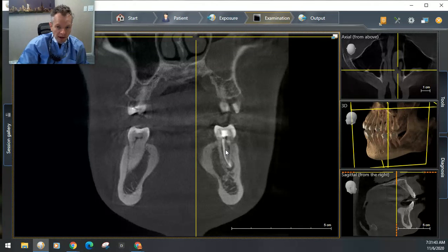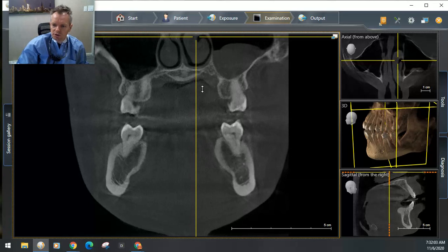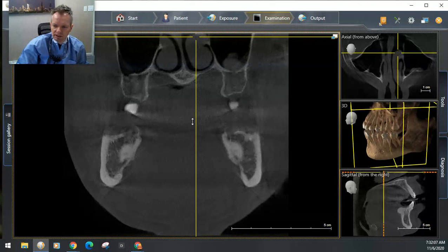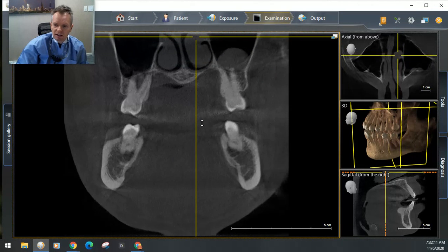We could either be proactive and treat this lesion or just keep an eye on that and over time evaluate and see if that is growing. Is that scar tissue or is that an active infection? As I go back, again, look at the maxillary sinus. You could see the difference of the inflammation in the upper left maxillary sinus versus the right sinus, which is nice and clear. So we always want to make sure that these types of issues, like the inflammation in the sinus, are not odontogenic, meaning that it's not related to the teeth.